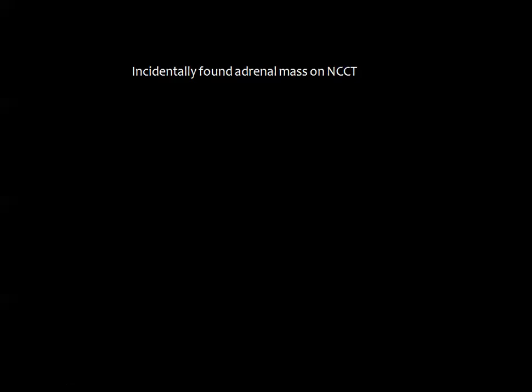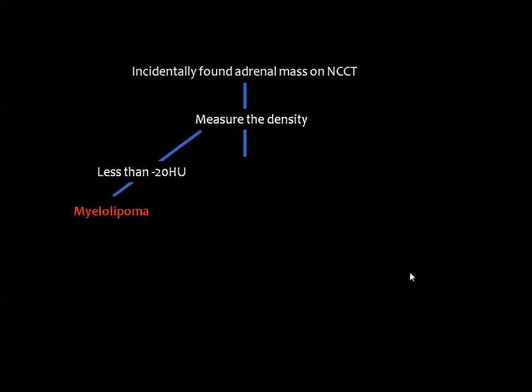Then to conclude this lecture, if you are confronted by an adrenal mass that is incidentally found on non-contrast CT scan, you measure the density. If the density is less than minus 20, if the density is that of fat, then you consider gross fat myelolipoma. If the density is around 0, minus 10 to plus 10 Hounsfield unit, then you consider the possibility of lipid-rich adenoma. Then inject contrast.